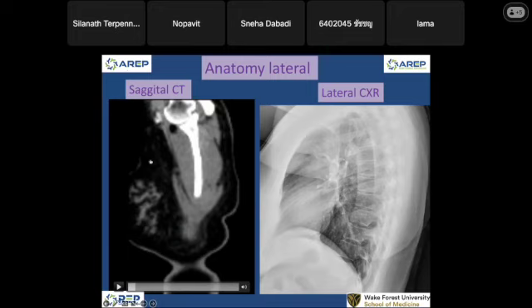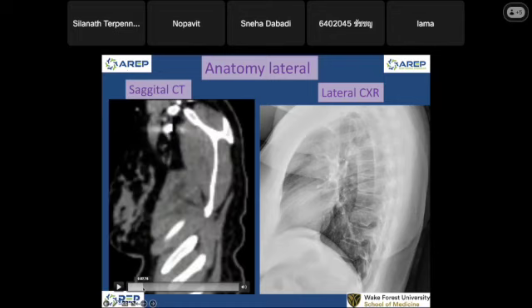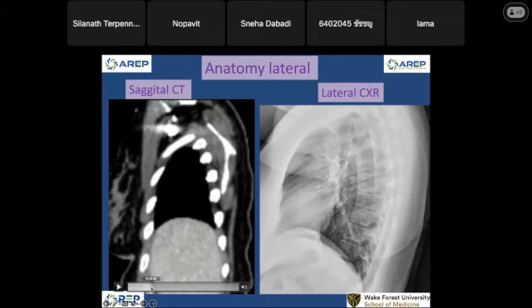This is fat. Look at the fat density on CT, super dark. This is the fat in the muscle. There is a small lipoma. And as we go further, you see a little bit of ribs, scapula, spine here. Go further. This is on the right because we inject contrast. This is contrast in the venous system. And this is the liver.